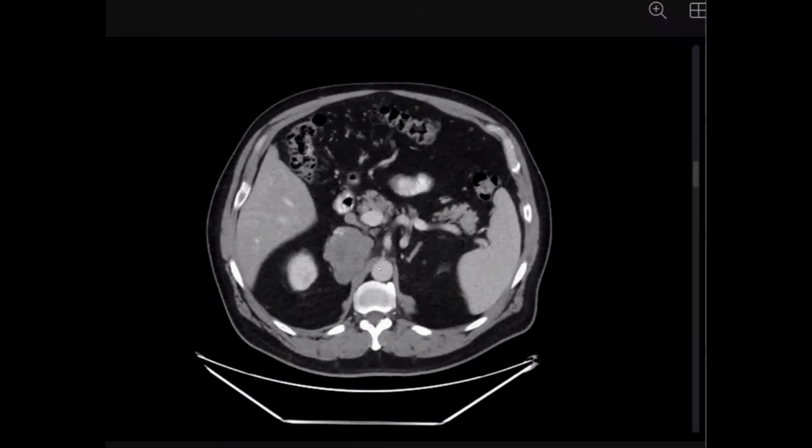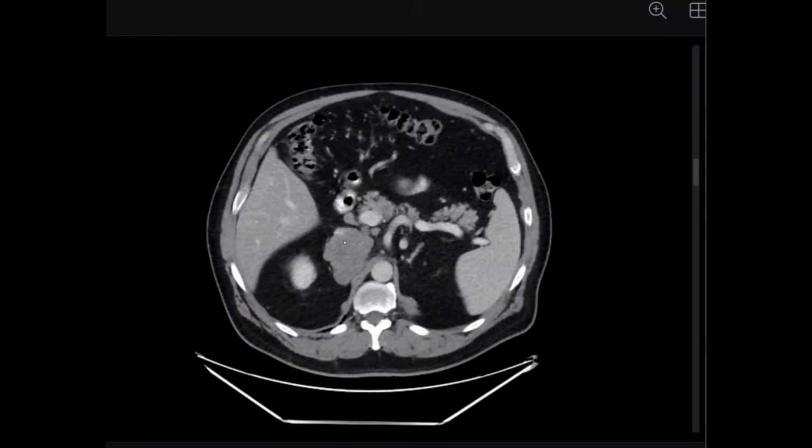Can you give me the hand, please? We have a retroperitoneal mass with intravascular and extravascular components. Okay, we have two different components, inside the IVC and outside the IVC. We have two possibilities. Either it's arising from the IVC and going outside, so this is a case of leiomyosarcoma. The second possibility may be a retroperitoneal sarcoma, like undifferentiated pleomorphic sarcoma, for example, or the initial name, malignant fibrous histiocytoma, invading the IVC. So we have two different possibilities.